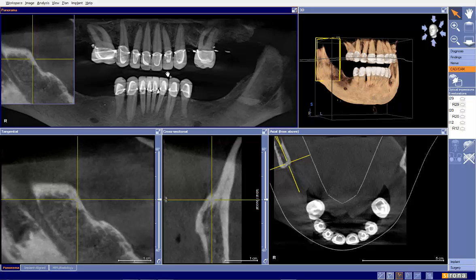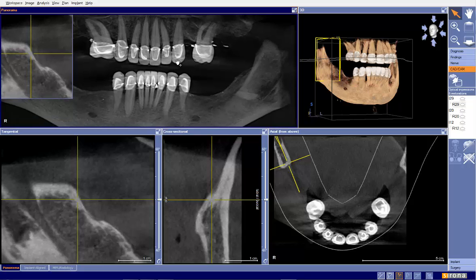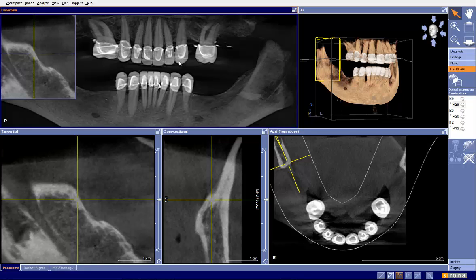Based on the general rule, when we have circumferential restorations, we need natural teeth to be able to align the data to. And that's the rule I've always followed. But in looking at this case, we can see that our initial reaction should be that this is an upper and lower classic guide case, if we're intending to do upper and lower.